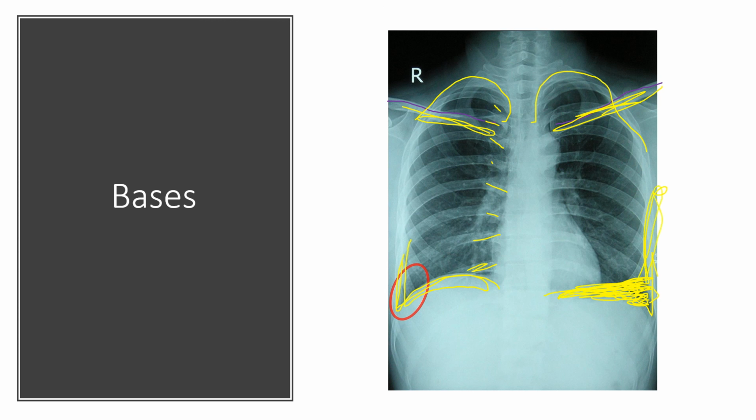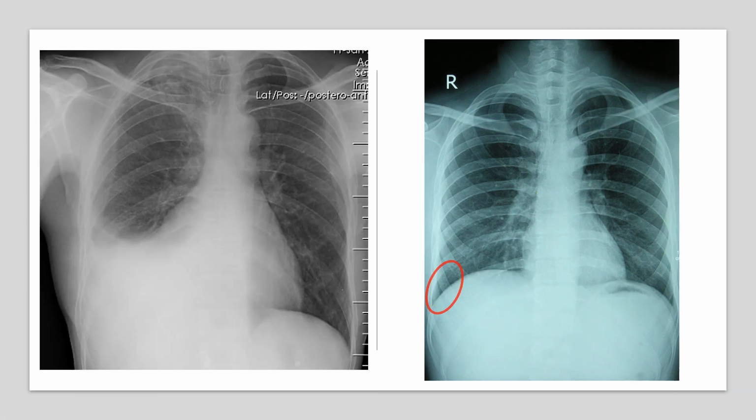And if that happens, then that's a sign of either a paralyzed hemidiaphragm or a pleural effusion. Something's going on that's not allowing my base to expand, right? So if I have a bunch of fluid in my pleural space, it could be restricting or pushing that up. Things like that could easily be going on. So when we're looking at this one, here's the one that we talked about on the right, a normal costophrenic angle, right? Very, very sharp.